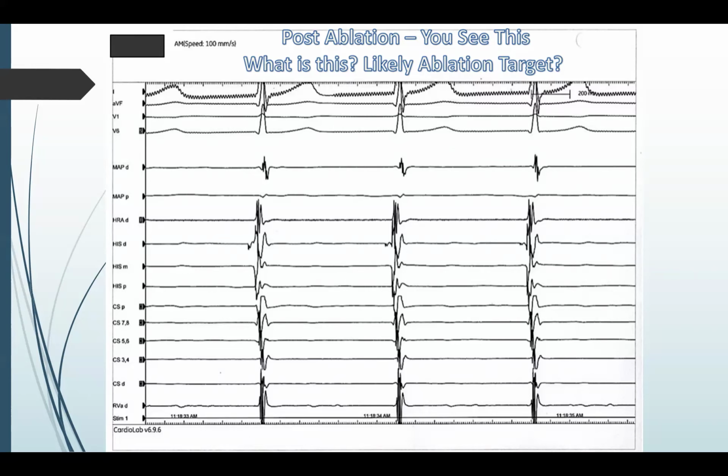So in general, when someone's in junctional rhythm, we believe that the His bundle is firing at a faster rate. So is there any evidence of the His leading the charge in this rhythm? And I might add, this is a low rate, like a rate of about 70 or 60. So, yes, because I think where you see that the most looks like in your distal, that deflection there. Yeah, this is the His deflection, followed by a ventricular electrogram.